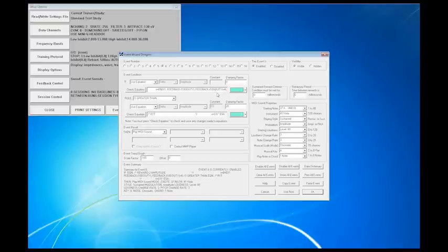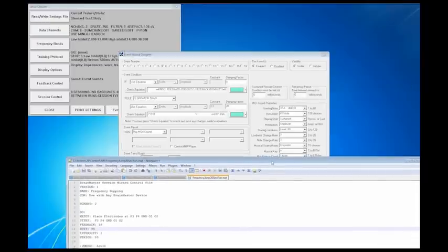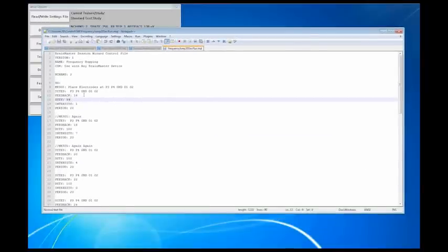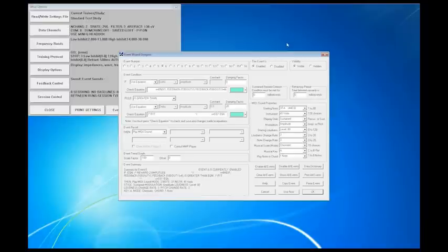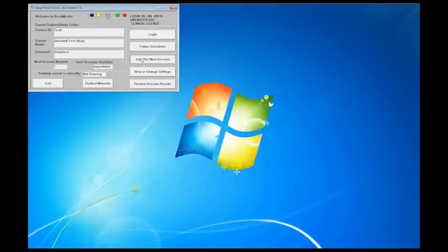Now, why do we do that? Because that is how this right here gets 2 different bands to be at different levels. We're both using the same variable of feedback, so they both should be 16 and 20. But by having the duty minus 100, or I forget, was it 100 minus duty, by subtracting 99, we now have a value of 1 that we're subtracting off of that 16 and off of that 20. Once again, I do like to show more than I talk about all of it, but we're going to run it in simulation so you can see it in action.